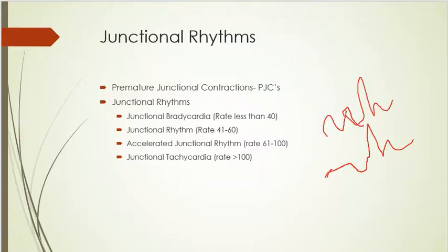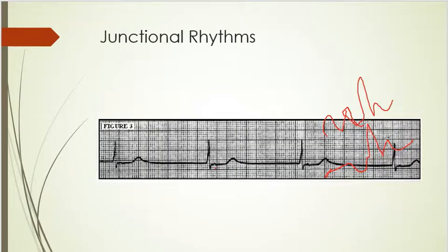All right. So let's go down here to the next one. There we go. Okay, so let's erase this drawing and let's look at this. If you were to just look at this and you don't go through your 5 steps, you would just tell me this is sinus Brady. But you need to start your 5 steps every time.